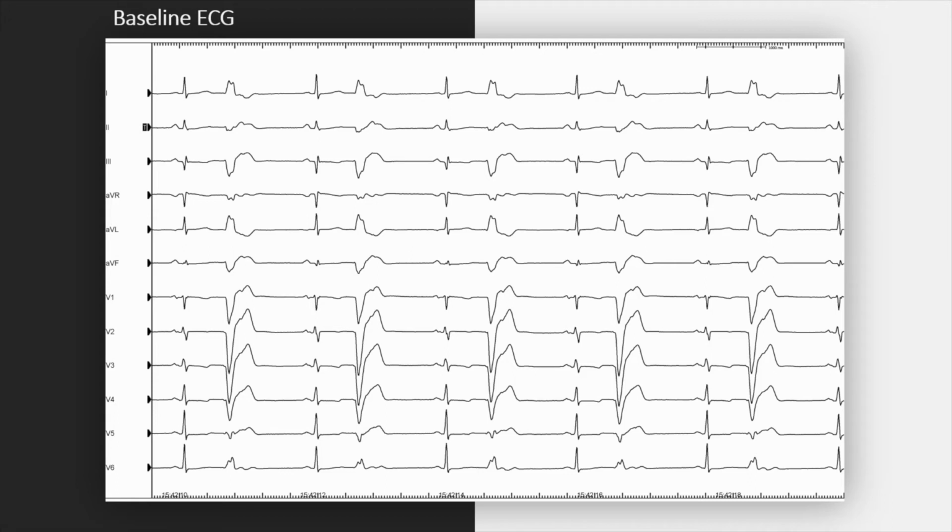The anterior papillary muscle in the right ventricle has a wider QRS complex with a notched appearance in the precordial leads, and anterior RV papillary muscle usually has a superior axis with a late R wave transition as compared with septal papillary muscle arrhythmias, which often have an inferior axis and an earlier RV transition.